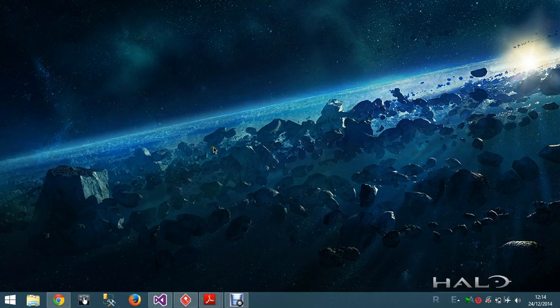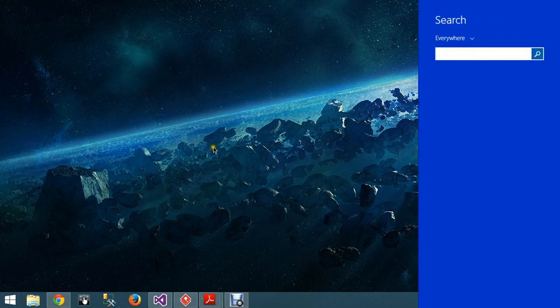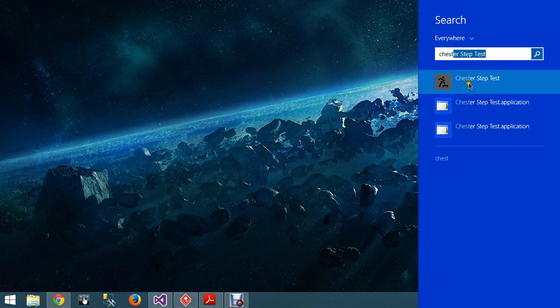Hi everyone, we're going to see how to use the Chester Step Test program today. First, look for the program files in your old program list if you're in Windows 7 or XP, or alternatively under the search program in Windows 8, in my case. So let's look for it. Here we are.